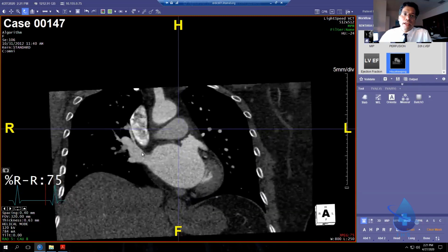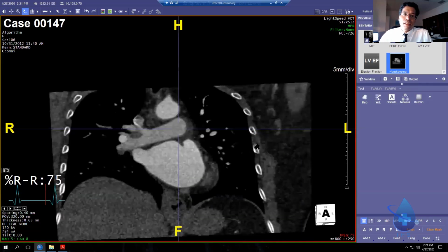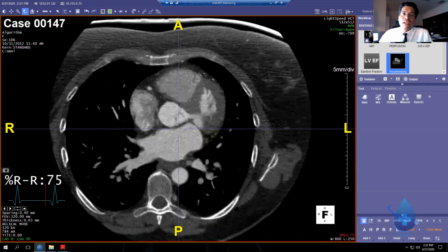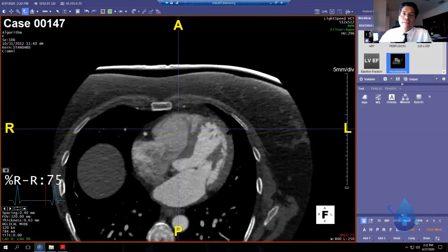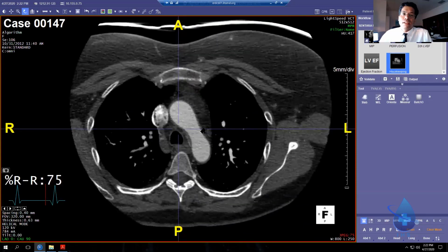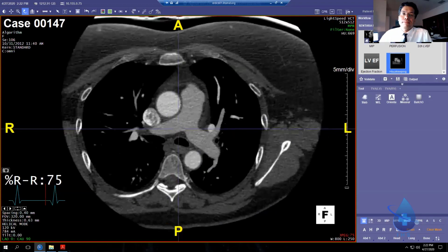Okay. I kind of think about it in 4 quadrants. Then I hit F on the keyboard and do it again the way the radiologists do. Cut into the heart. There's the right ventricle. Put it in your crosshair and then follow it up to the main pulmonary artery, right and left pulmonary artery, and then cut in left and right.